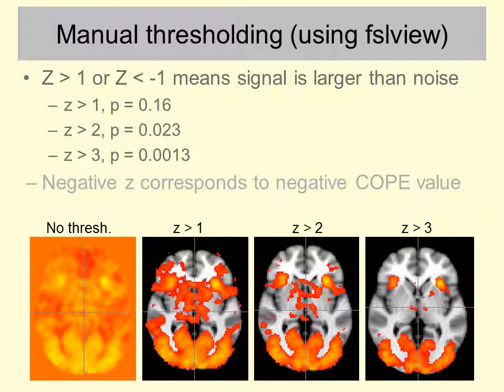If we do the same thing but with a Z threshold of 2, what we're doing now is saying we're only prepared to show values on our heat map where that would occur 2.3% of the time were there no signal in the data, because only 2.3% of the area under the curve corresponds to z-scores greater than 2. And down here in the image we see that these blobs are now getting somewhat smaller, but they're not a lot smaller by moving from Z1 to Z2.